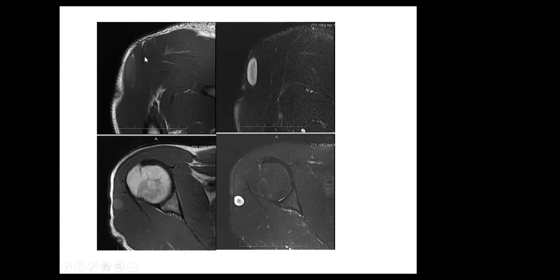So the findings here, we would say there is an oval-shaped soft tissue lesion within the deltoid muscle. I don't think you specified what muscle it is. I think you said it's a lesion in the intramuscular compartment. So again, we need to really know the muscle anatomy, whether it's a muscle injury or tumor. We have to specify what muscle it is.